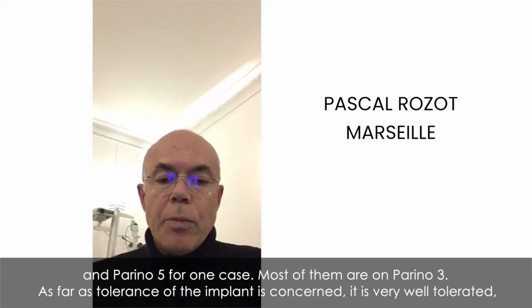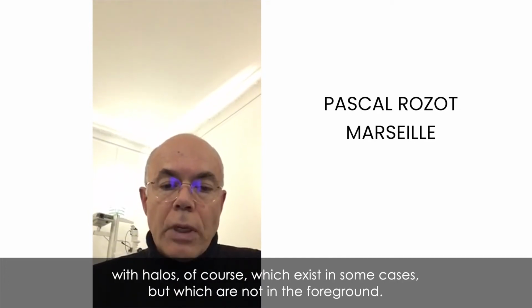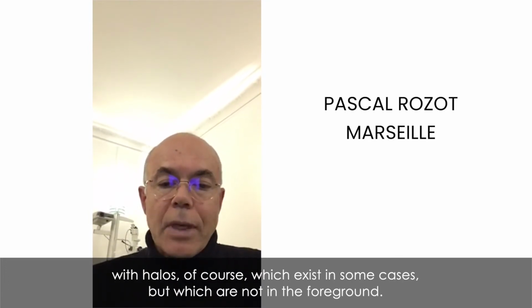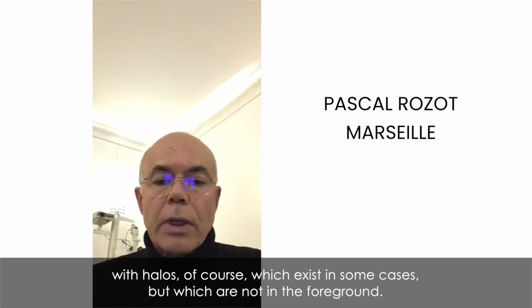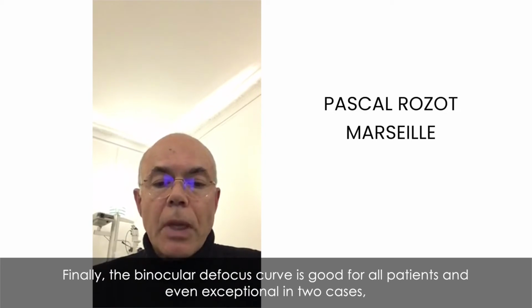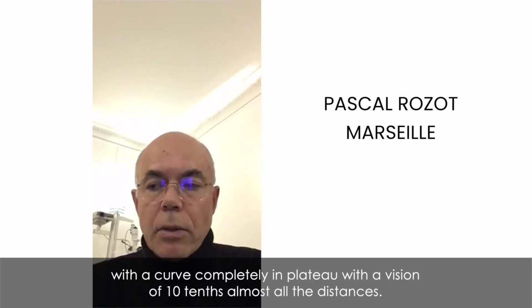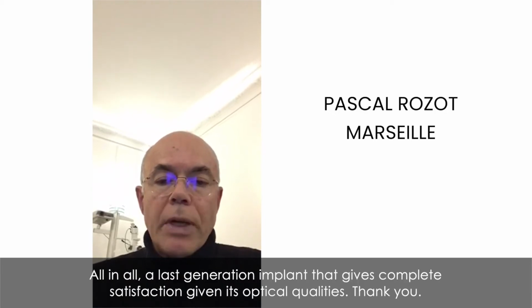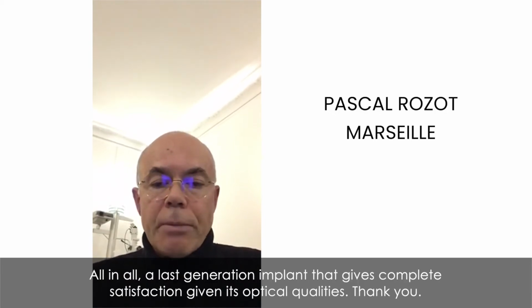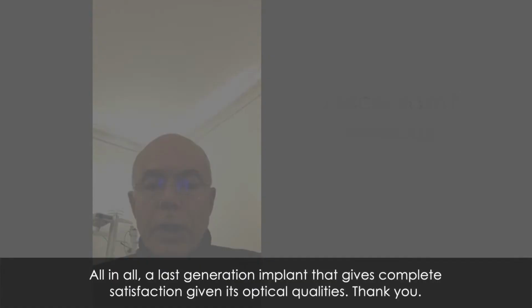As far as tolerance of the implant is concerned, it is very well tolerated, with halos, of course, which exist in some cases, but which are not in the foreground. Finally, the binocular defocus curve is good for all patients and even exceptional in 2 cases, with a curve completely in plateau with a vision of 10/10 at almost all distances. All in all, a last generation implant that gives complete satisfaction given its optical qualities. I thank you for your help.